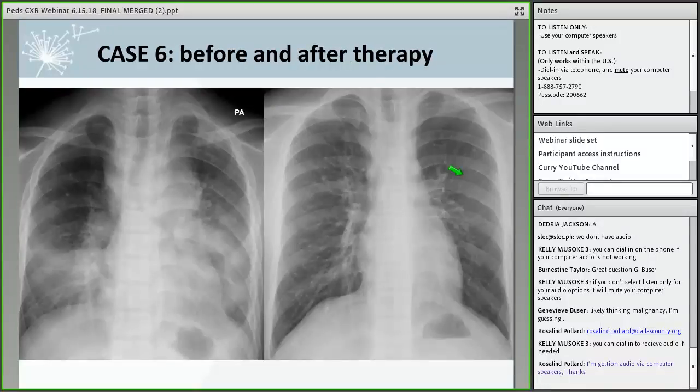Yeah. So the film on the left there is his first film, and the film on the right is after 1 year of therapy. Fortunately, he clinically did amazingly well after a very rough first month of treatment, when it wasn't quite sure how it was going to play out. But what do you think of that completion of therapy film, Dr. Vu? Oh, wonderful. Great results.